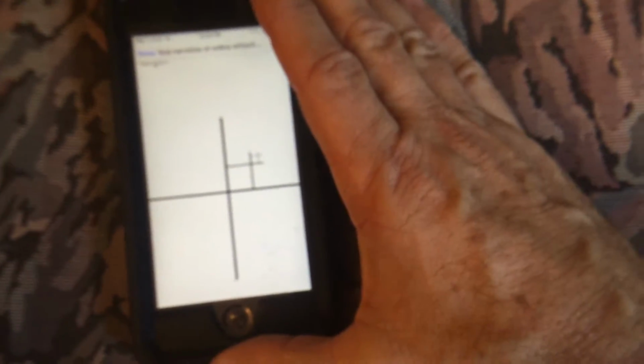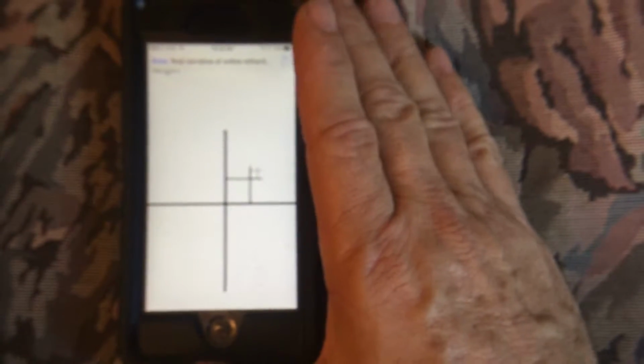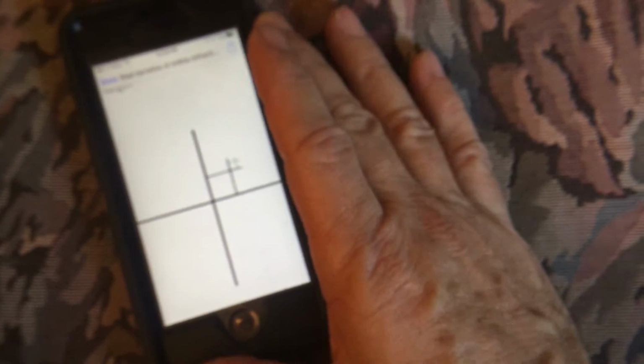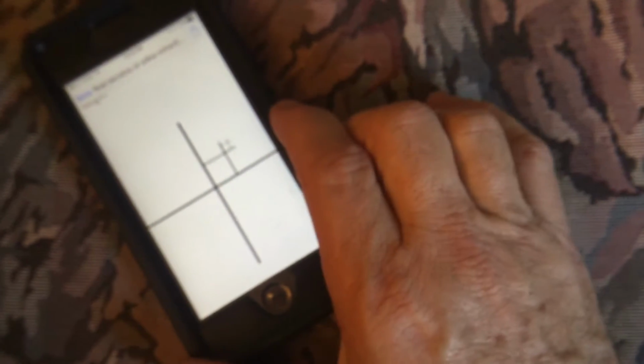And so since the vertical line is not narrowing, you have to switch your strategy now to try and find or align the phone along your astigmatism axis line, which is the widest spot that the line will appear. So we're now rotating the phone in either direction. Really, it doesn't matter for without astigmatism.